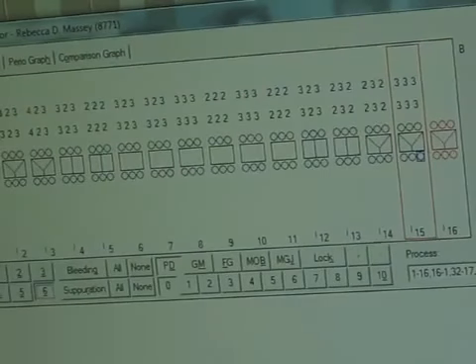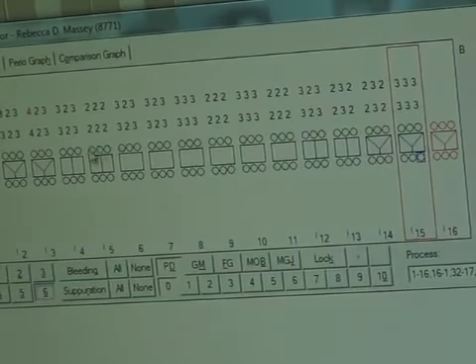It will automatically go to the lingual side after you are done charting the buccal surfaces.